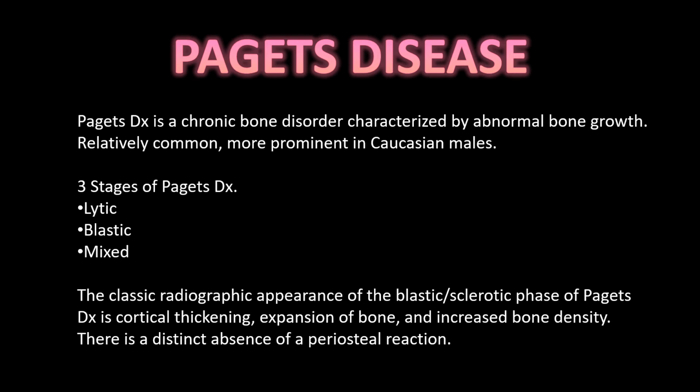And this patient has confirmed Paget's disease. Paget's disease is a common chronic bone disorder characterized by abnormal bone growth throughout the skeleton. It's usually seen in older Caucasian males. There are 3 different stages to Paget's disease: the lytic, blastic, and mixed.